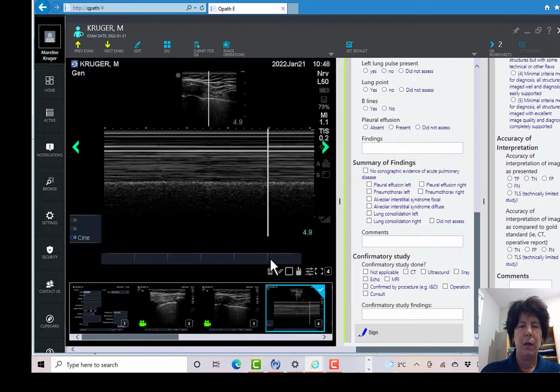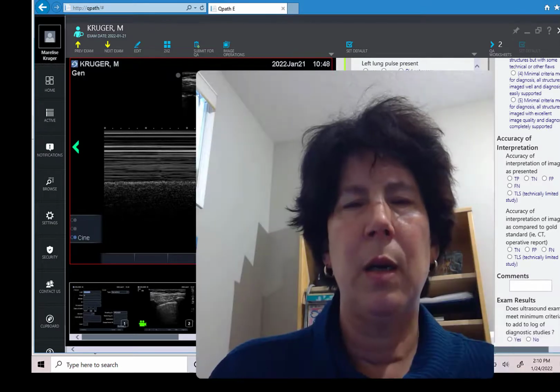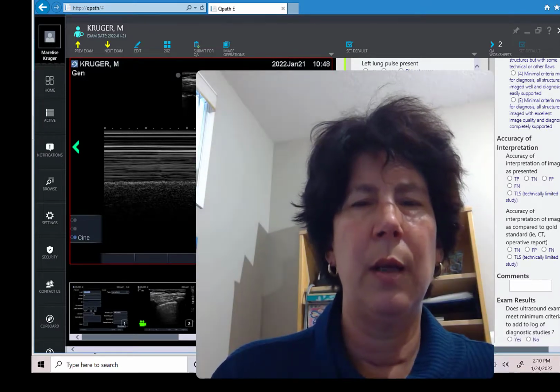And we can show you a little bit how these annotations and measurement boxes and arrows work when you come to us. So this is for the most part how you will set up your daily work.